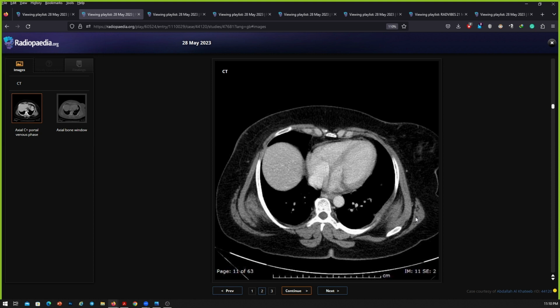So it could also be soft tissue myxomas bilaterally. Okay, any other differential other than soft tissue myxomas given the symmetrical appearance of the bilateral lesions? Or if this is a young person, could it be brown fat hypertrophy?